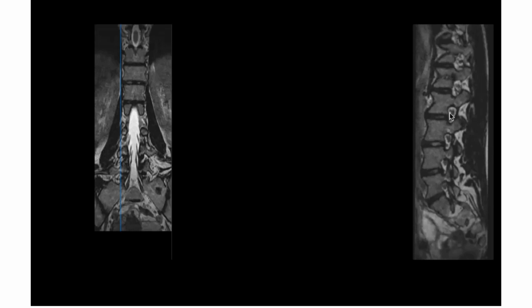But if the herniation is there and it is pushing the nerve upwards and there is hardly any space between the pedicle and the nerve root, that means this herniation is sufficient to cause compression of the exiting root. So when we do transforaminal, you have to see this section, because a lot of times the herniations are not typically central, typically paracentral, typically foraminal. Most of the time they're a combination of that. Maybe a central herniation extending up to the paracentral area, or a paracentral herniation extending to the foraminal area.